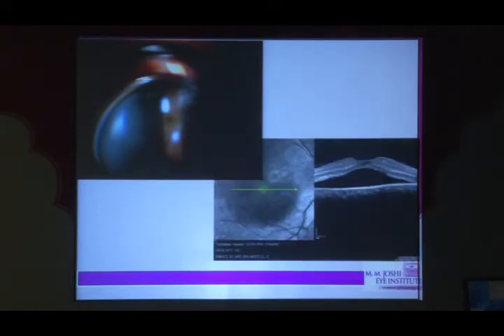And this was another thing I wanted to explain. When one of my fellows showed this case, he said, look at this. Seeing the slit, I couldn't see anything. I thought, okay, this could be a normal macula. But then after widening the slit, you can see there is some boundary here. Okay, this is the subretinal fluid. So with just a small slit, sometimes you have to widen the slit to get a complete picture. But I usually love using indirect ophthalmoscopy to get a better view in case of patients with CSR. And this was the OCT picture showing the subretinal fluid.